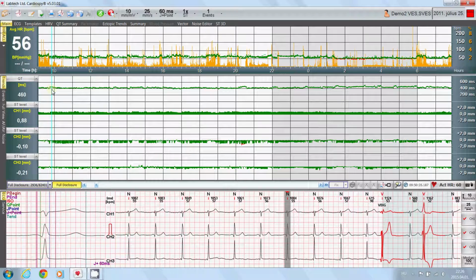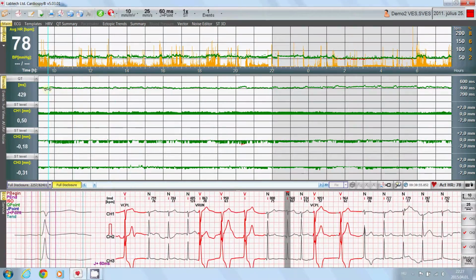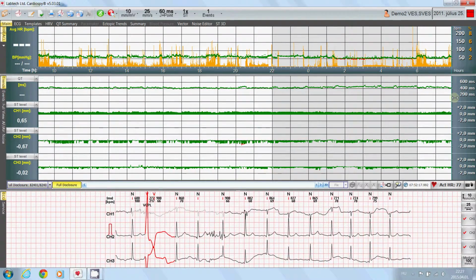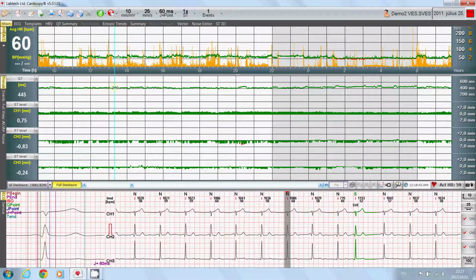As the very first step of the Holter analysis, I always suggest you to quickly glance through the ECG signal to check for any major abnormalities that would require a repeated Holter ECG examination.